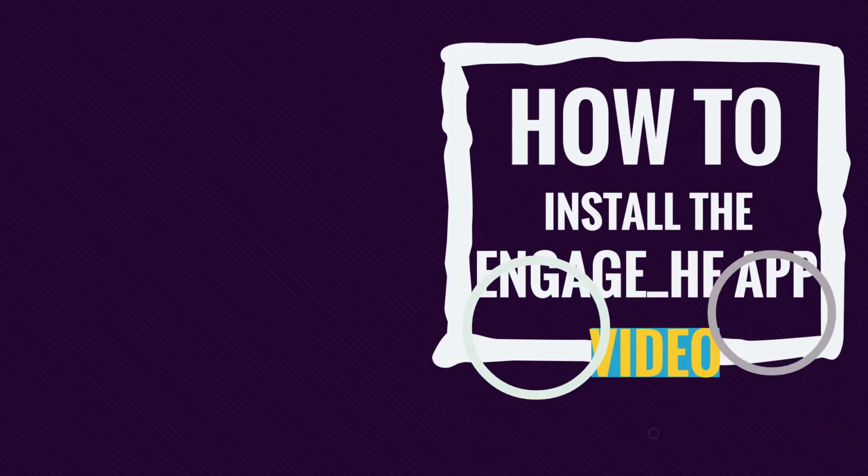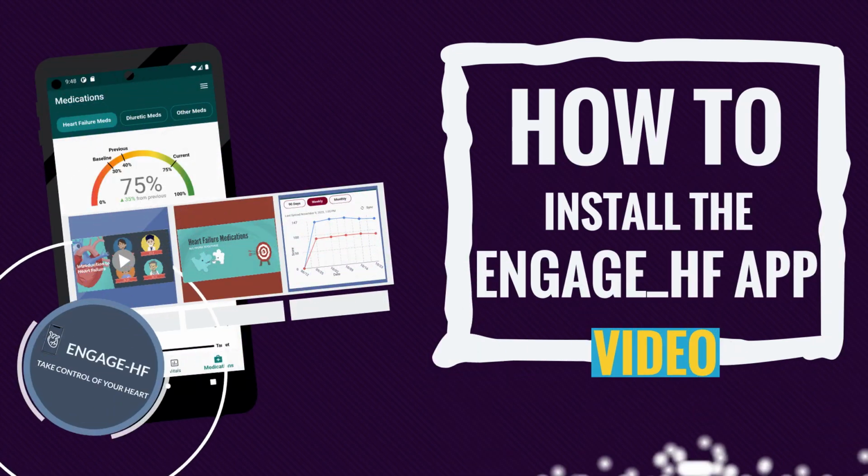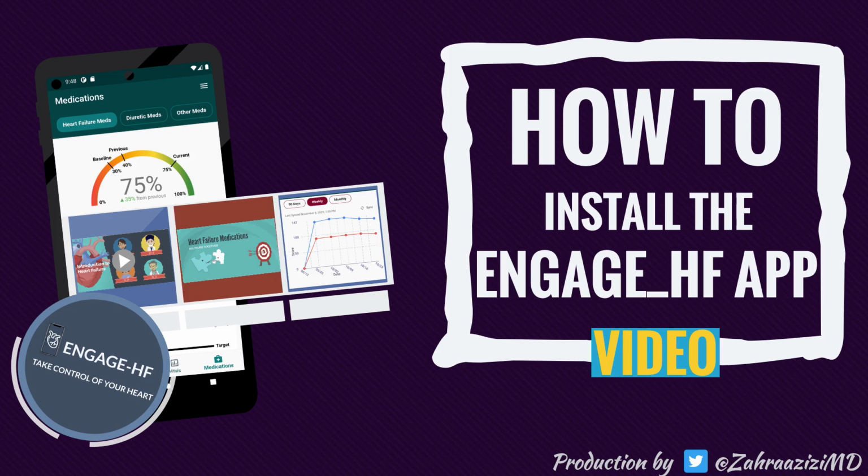Welcome to this instructional video where we'll guide you through the process of installing the Engage HF app and creating your account. Follow along to discover how this app can revolutionize your heart failure management.